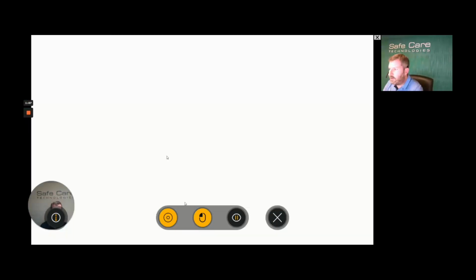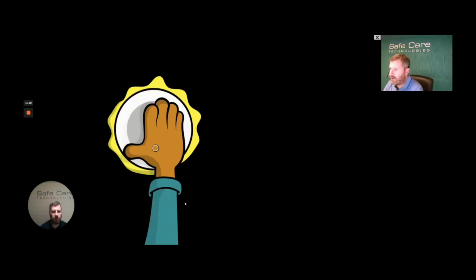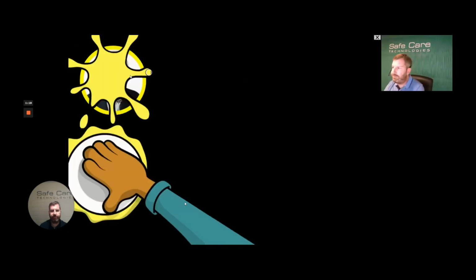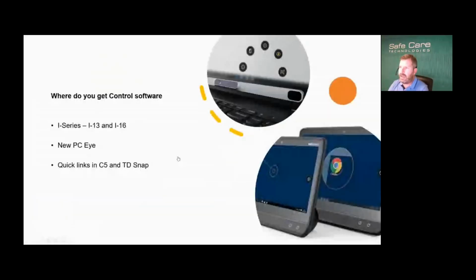start, and now my menu will disappear, and now, as you can see, I can start interacting with it as I would in any version of eye gaze software. So that's simple mode. Again, primarily used for maybe somebody that just wants a simple left click, and that's all. We don't want the full interaction menu, or if we're using it for sensory software like Look to Learn or Magic IFX as described.